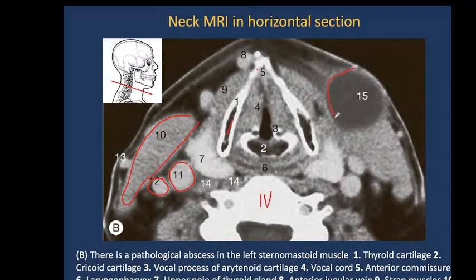Please see the pathological object here, number 15. This is the abscess. Abscess is the cavity which is filled with the pathological fluid which produced after inflammation.